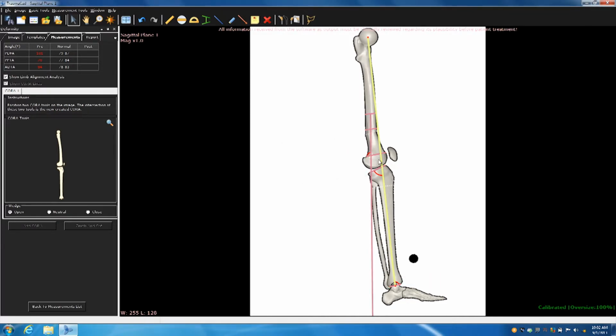Your hinge point's here. And so from a mechanical axis point of view, you would say, this patient's doing pretty good, but they're coming in complaining of knee pain, and their knee looks a little funny. So with this kind of deformity, they'd have a prominent patella. And if you want to do your anterior cortical lines, which will be a little difficult because of this deformity, you might say, well, what's going on at the knee?